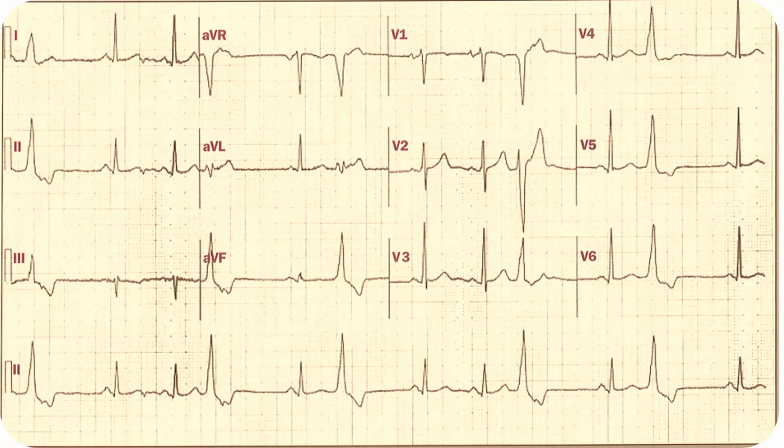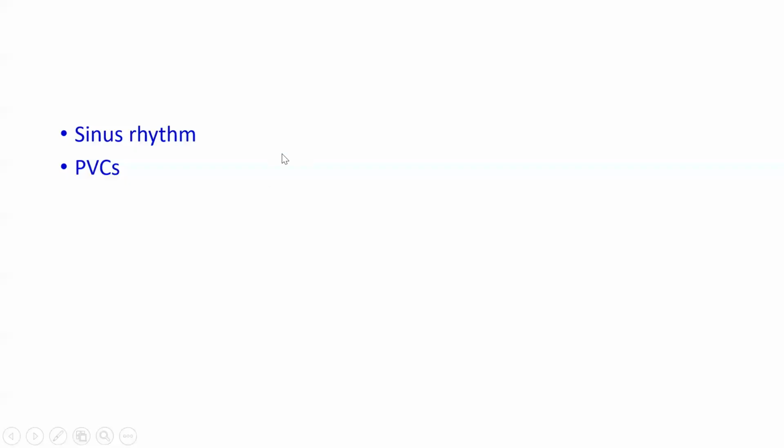So in the ECG, there is a sinus rhythm or a normal sinus rhythm, except when there is premature ventricular contraction. Premature ventricular contraction coming mostly as PVC alternating with normal conducted beats. So the coding for this ECG is sinus rhythm or normal sinus rhythm with PVC.